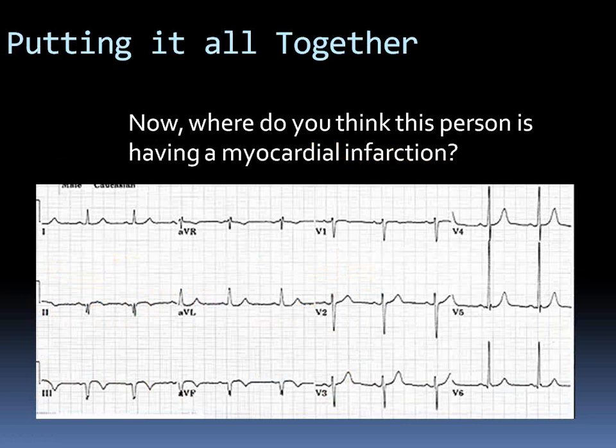Question for you guys. This is the same ECG which we had looked at before. Where do you think this patient is having a myocardial infarction? Which lead is showing some ST elevation? AVR has ST elevations? Sure.